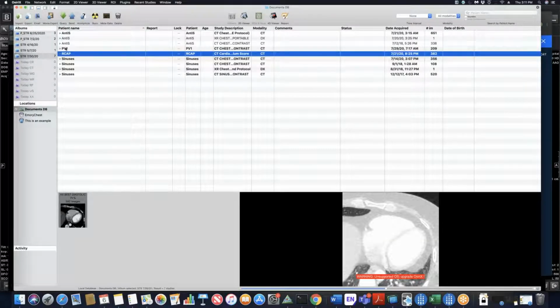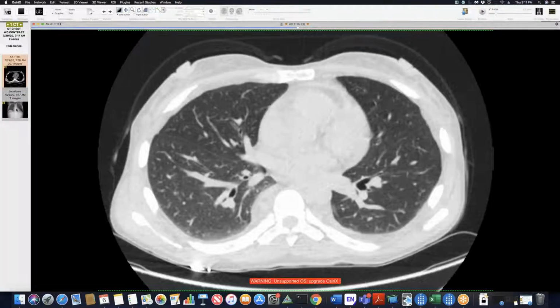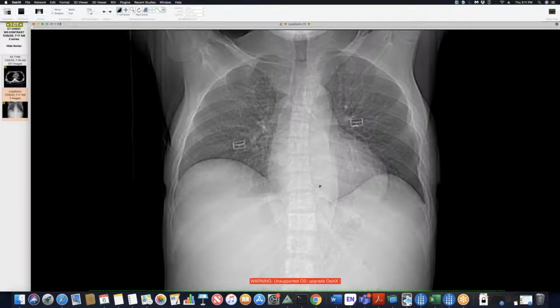And one last one. I will show the scout radiograph, and I'm going to withhold the history, so it's not too obvious, but these are the abnormalities here, these lines right here. These are the paravertebral lines, and you can see they are too wide. Here's the descending aorta, and normally that should be external to the paravertebral stripes. And in this case, the paravertebral stripes are way out here.